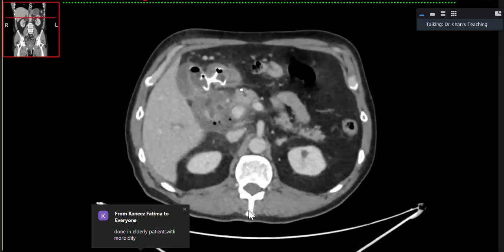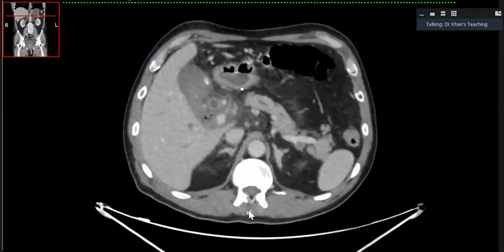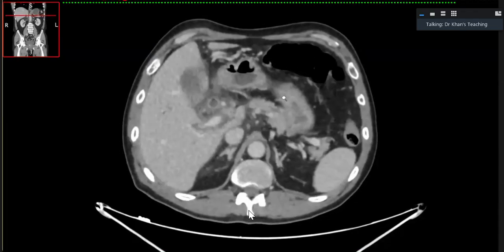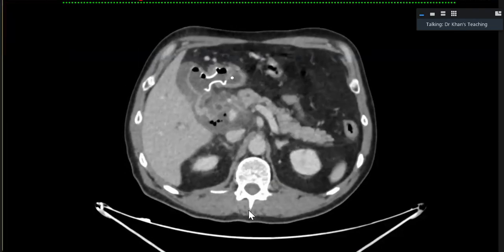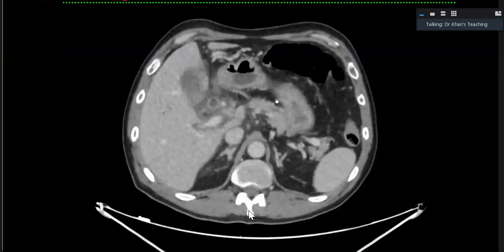So basically what they do is they have to drain the biliary system. They can drain it into the duodenum, they can drain it into the pyloric canal. In this particular case, it is self-expanding, it expands like this and expands like this. This case is a story case, and these kinds of cases are very important for the exam.